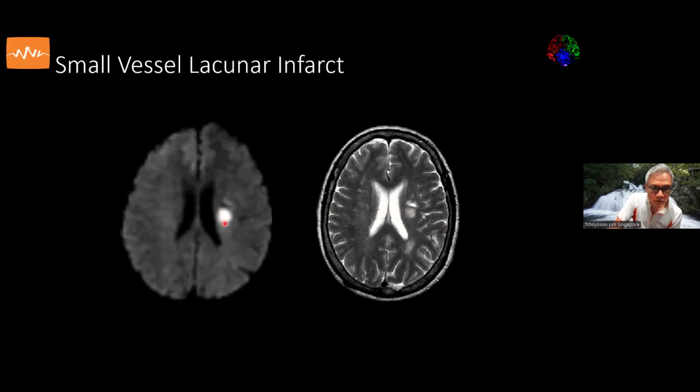You'll also notice that this patient doesn't just have this single infarction. There is another infarction located anteriorly, and this has very, very similar signal intensity to the CSF, representing a chronic infarct that has taken place years and years ago.